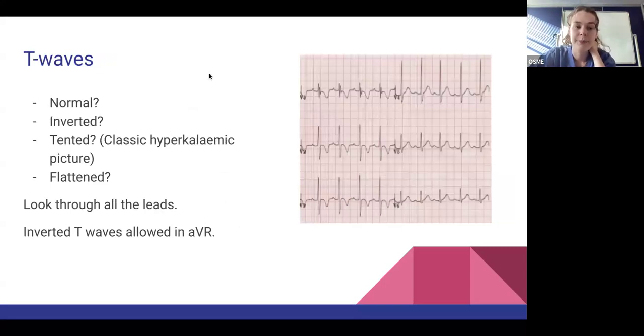T waves, are they normal? Are they tented? So hyperkalemia, tented T waves. Are they inverted? Are they flattened? So hypokalemia would be the big cause of that. Look through all the leads again. In AVR, you would expect inverted T waves, so don't panic about that.